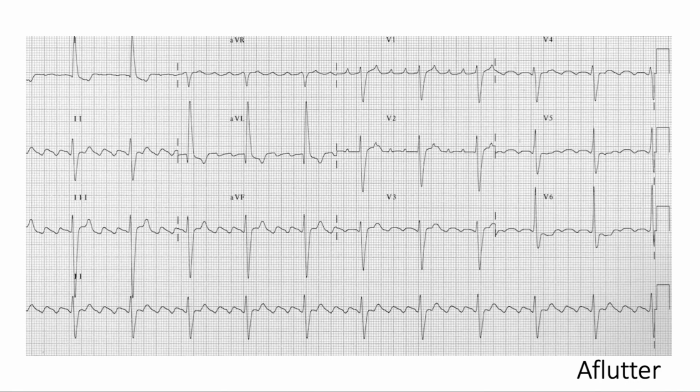So for example, let's go back to one of our QRS complexes in the A flutter 12 lead EKG. We're going to start by finding a large box, finding a QRS that really falls relatively close to the large box. Then we start by counting the first one here, 300, 150, 100, 75, 60, and it's somewhere between there, so I can say it's about 70 beats per minute.